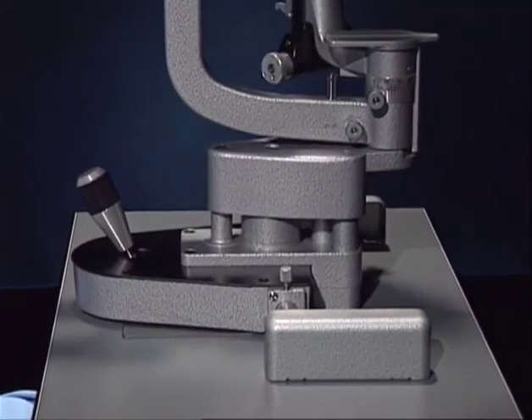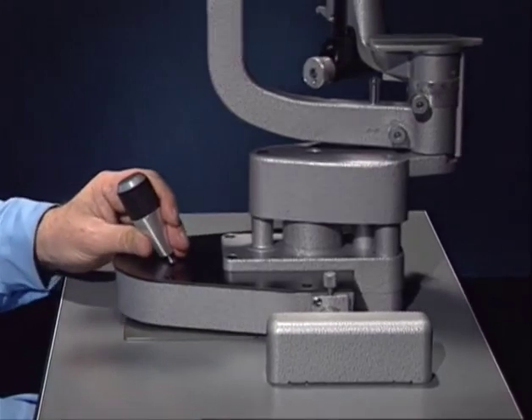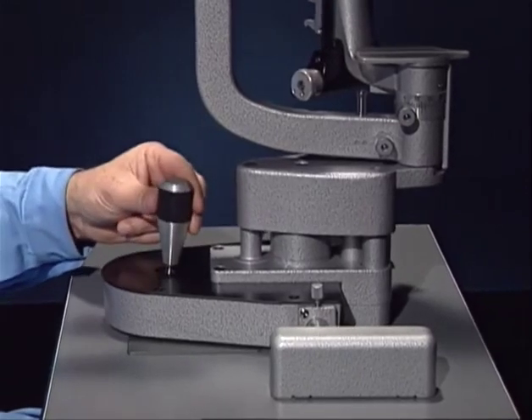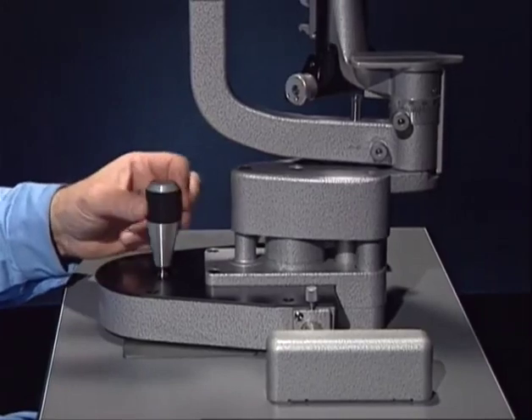The entire instrument base can be moved with the joystick. The general adjustments are made by shifting the joystick in the desired direction. For fine adjustments, just tilting the stick is sufficient. The level of the unit is adjusted by rotation of the joystick.